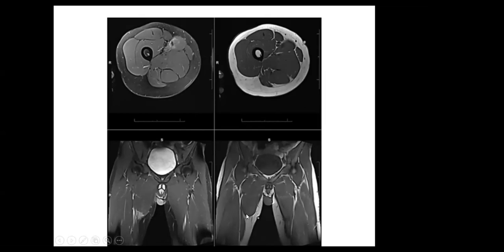So if you hear about bunching up, it is when the muscle is torn and retracted, and it looks like a rounded mass. So this rounding of the muscle stump is what we call bunching up. Sometimes it can actually mimic a soft tissue tumor. That's why we have a skin marker here, because it actually presented as a mass.